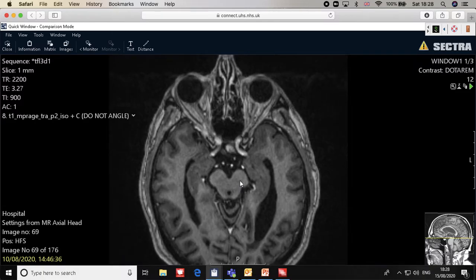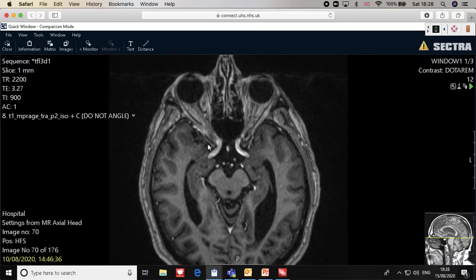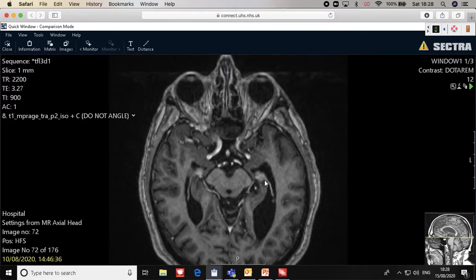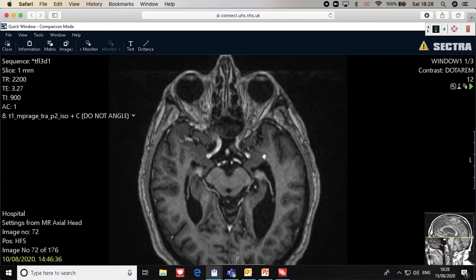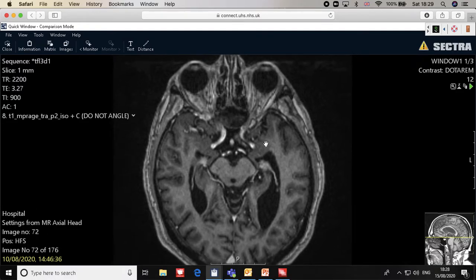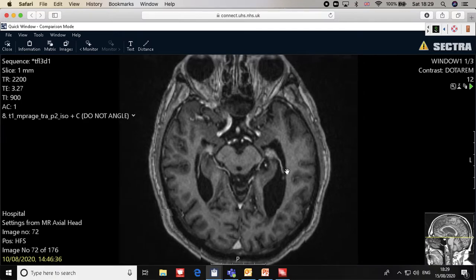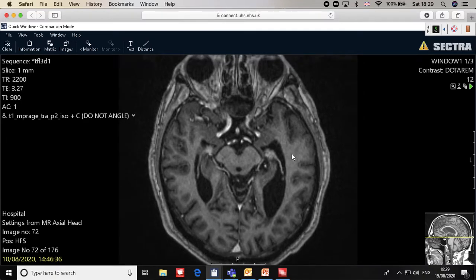So let's see the chiasm first, and then we will talk about the hypothalamus. I was just telling you that the circle of Willis is composed of the anterior cerebral artery and the middle cerebral artery. And here you can see it's an MRI. We did a lecture on how to differentiate between T1 and T2. But if you want to see anatomy, you have to go to the T1. In T1, white matter is white, the gray matter is gray.